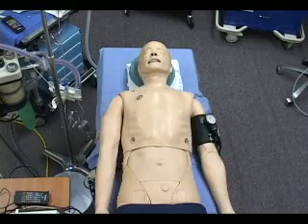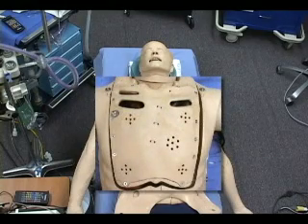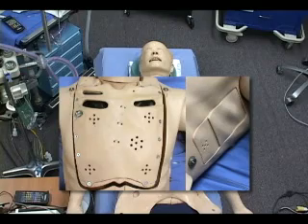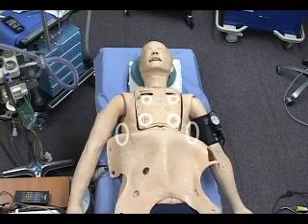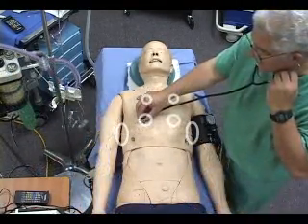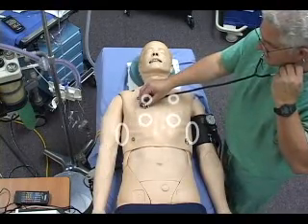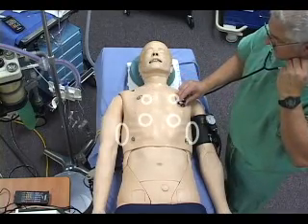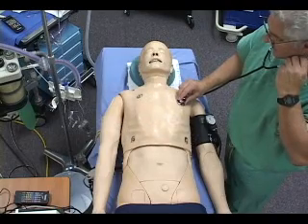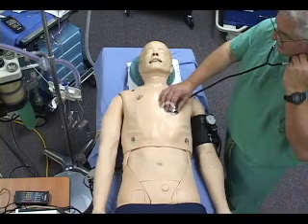Sounds emanate from the SimMan via small loudspeakers. These are distributed selectively over the anterior and lateral chest to provide breath sounds. When attempting to hear breath sounds, such as when testing for the correct placement of an endotracheal tube, it is necessary to place the stethoscope in the proximity of a speaker. Breath sounds are generally transmitted throughout the chest cavity, but can sound muffled when stethoscope placement is incorrect. Similarly, heart sounds must be auscultated over the left anterior chest, and they do not radiate.